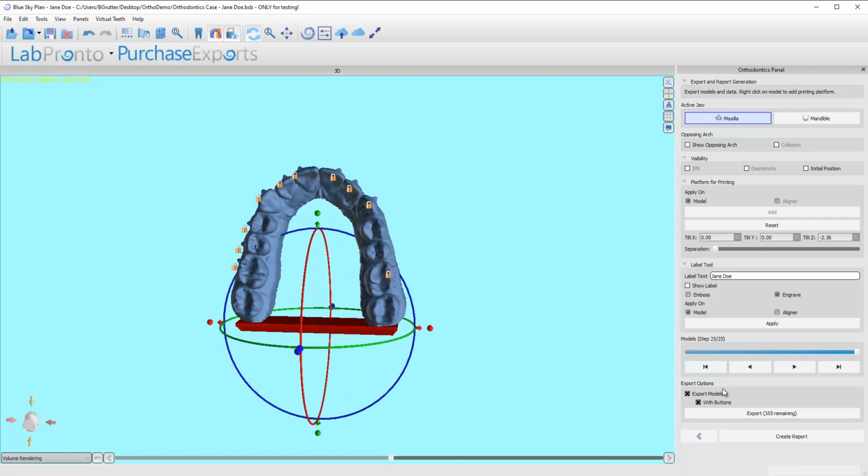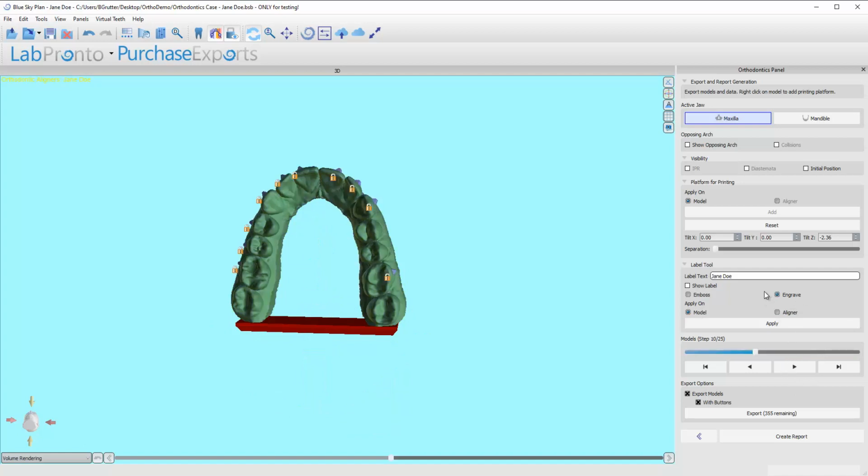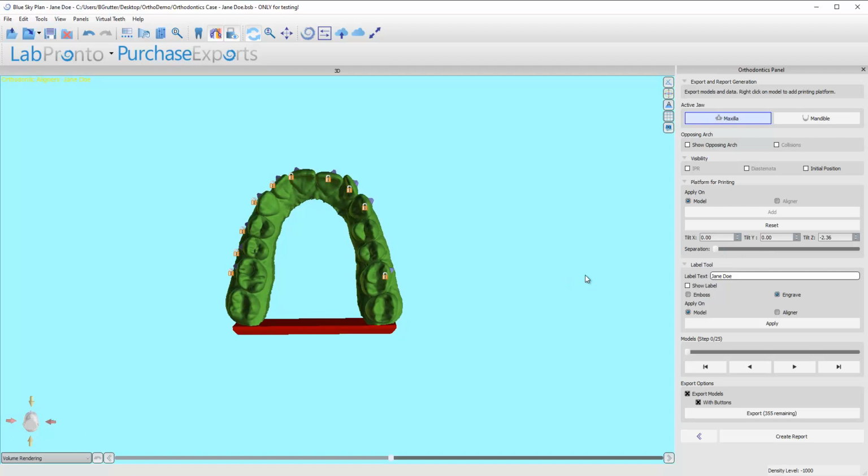Okay, and you can also separate it into two different platforms if you want. I used to do that. Sometimes I do it, sometimes I don't, but whichever you prefer.